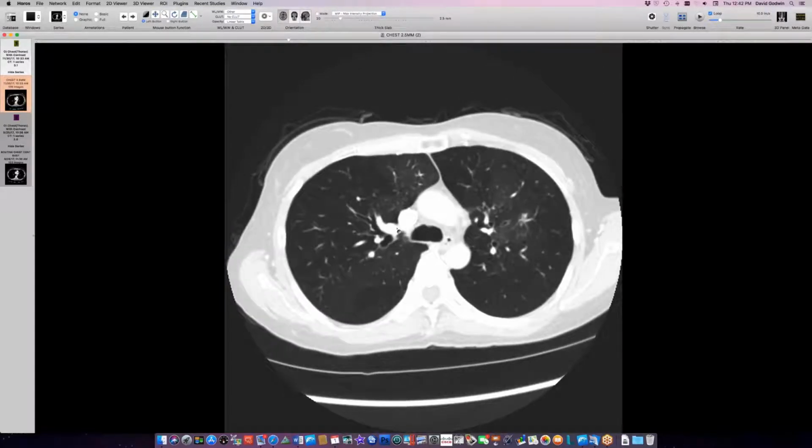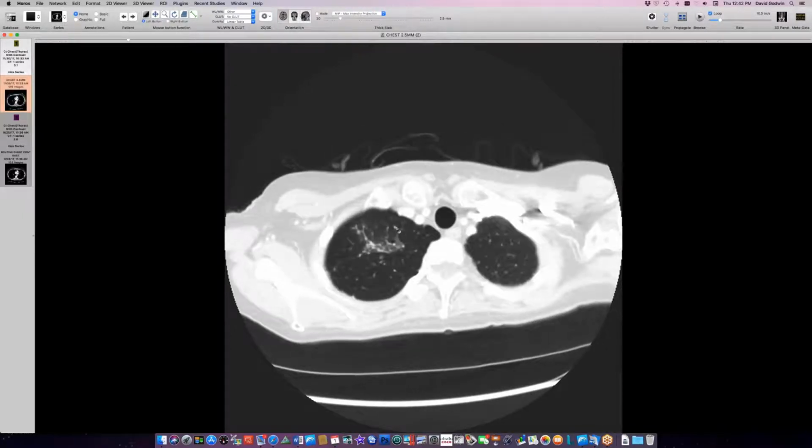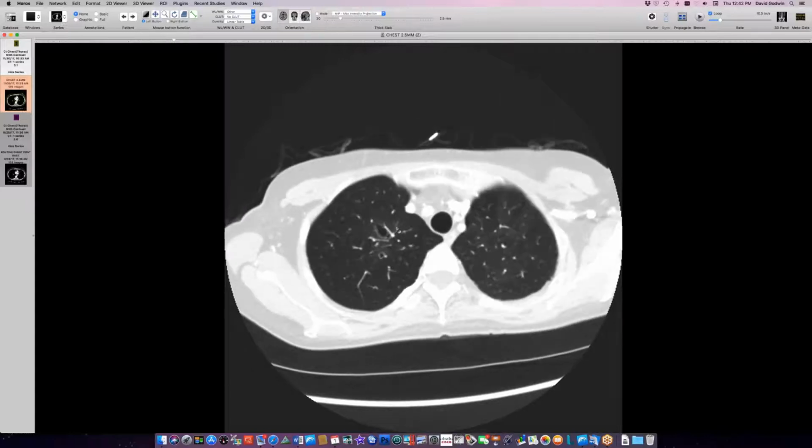When you go to the right upper lobe, that cavity, can you connect it nicely with the bronchus? Was it a bronchus that was destroyed and became dilated? It's almost oval-shaped.